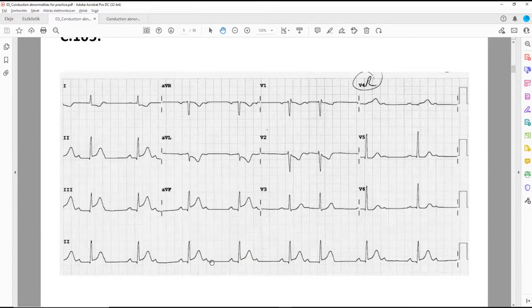So I would say it's not a Mobitz type 2, but a 2-to-1 AV block. We have two P waves, one conducted and the other not. So this is a 2-to-1 AV conduction abnormality. Now, the QRS is narrow, which is okay. The axis is fine. The ST elevation comes in the next seminar when we cover ischemic heart diseases, so let's stick to this one.